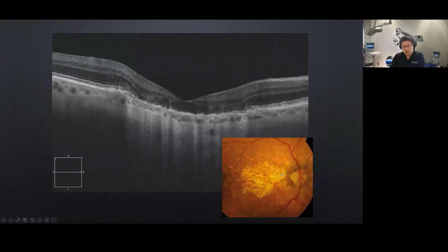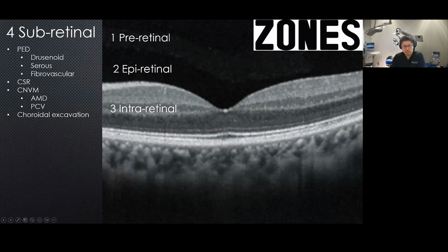And here's another patient with focal geographic atrophy. Vision is not going to be great. You can see there's hypertransmission resulting from loss of RPE. So let's follow the ellipsoid layer. You also see there's an abrupt termination of the ellipsoid layer with loss of RPE, and therefore vision is not great, and we would expect counting-finger vision.